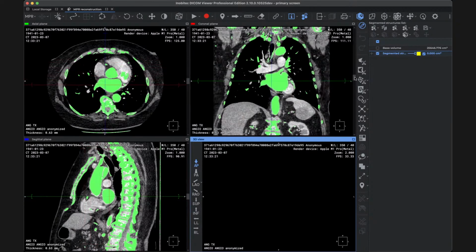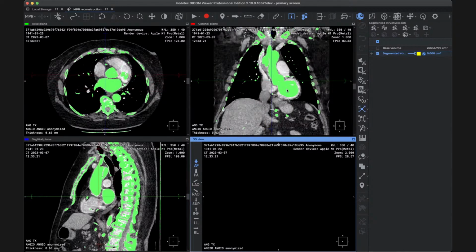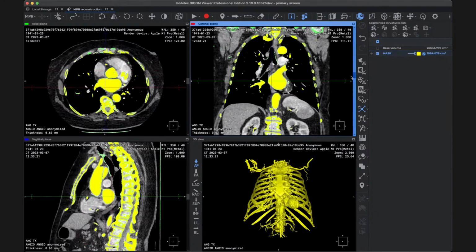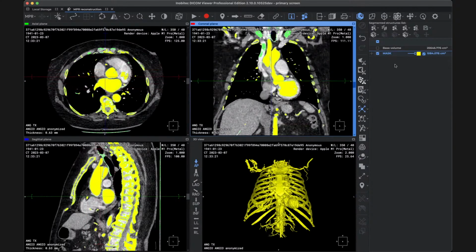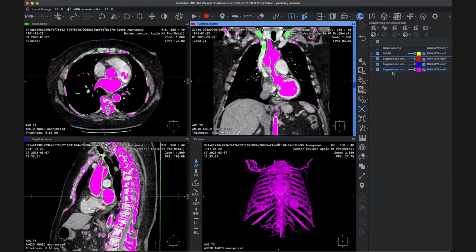And the bone structures are also marked. So, segmentation from point by mask again, click on the aorta, and we have our mask here. We're going to isolate the bones and the aorta, our structure of interest, and also the pulmonary veins that were selected. So we're going to multiply the mask three times: one for the bones, one for the aorta, and one for the pulmonary veins.